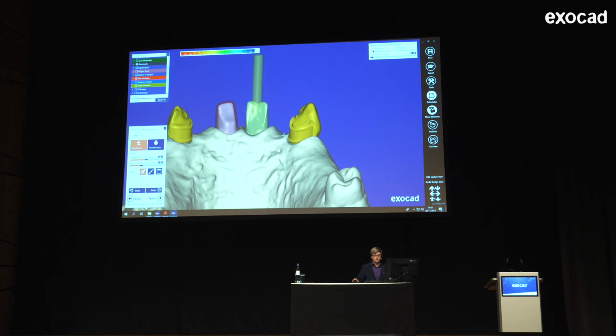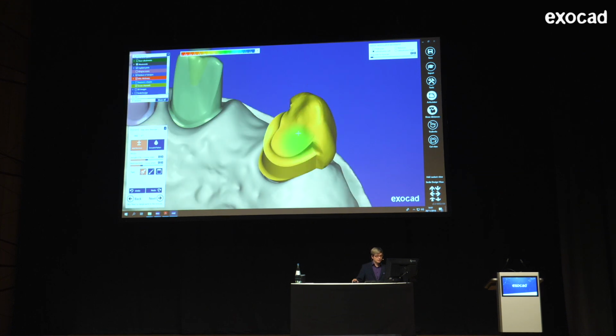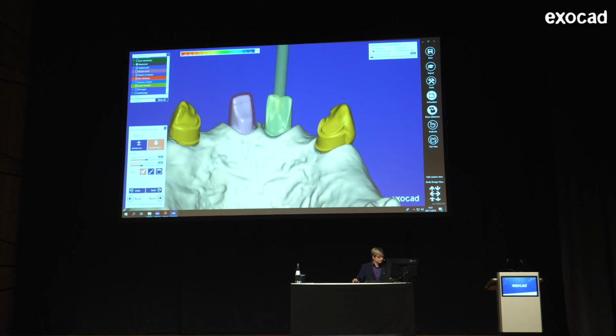Like in all the telescopic crowns, I could now freeform it, but only the anatomical parts and the ones up here in between the upper curve are activated for smoothing. So I can't smooth the parallel surface. But there's nothing I want to do here now, so I'm just going to the next step.